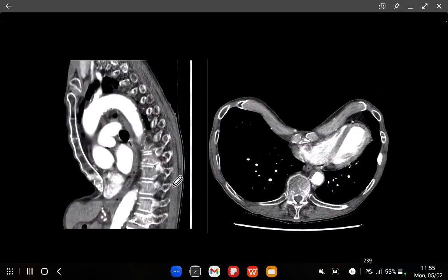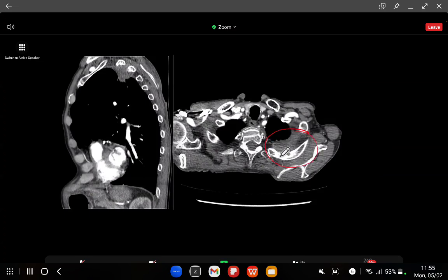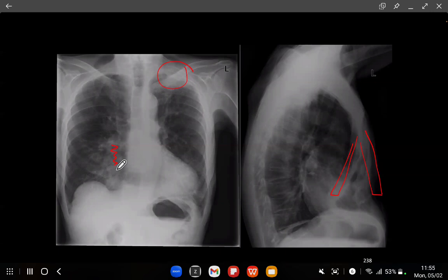And so when we did the CT, obviously that's the pectus excavatum, and there's the Pancoast tumour, which is already eroding the bone just here. So if I go back to that, there's the Pancoast tumour, here is the pectus excavatum. Sometimes you get two pathologies on one film which are unrelated. Pancoast tumours are very difficult to spot, and often present very late because you've got very subtle radiological signs.